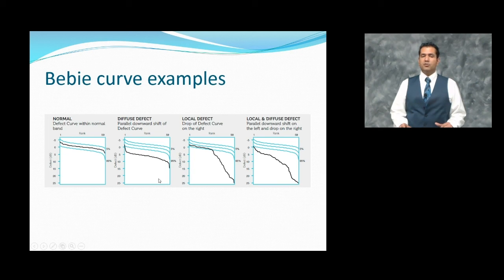Here are some examples of the Bebie curve. So here's a normal patient. The Bebie curve is falling within the normality indices. Here you see a diffuse defect. This could be due to cataract. You see the Bebie curve is shifted down. Here you're seeing a local defect where part of the Bebie curve is normal, but then there is a sudden drop down, or you're seeing a mixed defect that has a localized and a diffuse defect, meaning that part of the Bebie curve is parallel to the normality indices and then subsequently drops off.